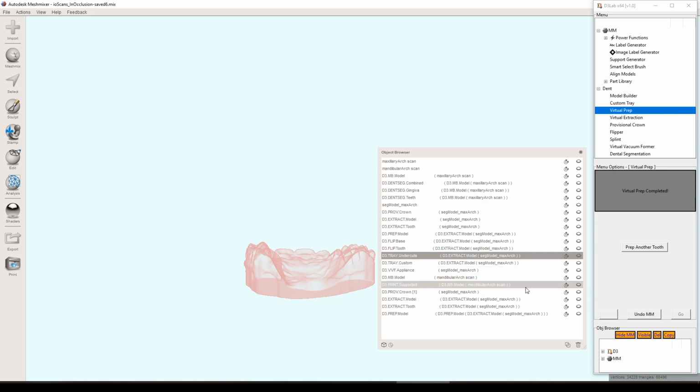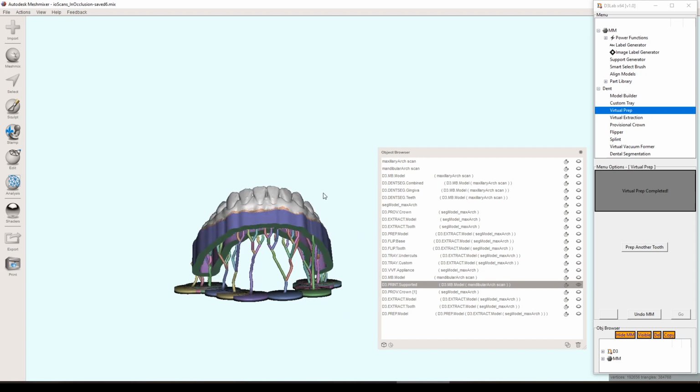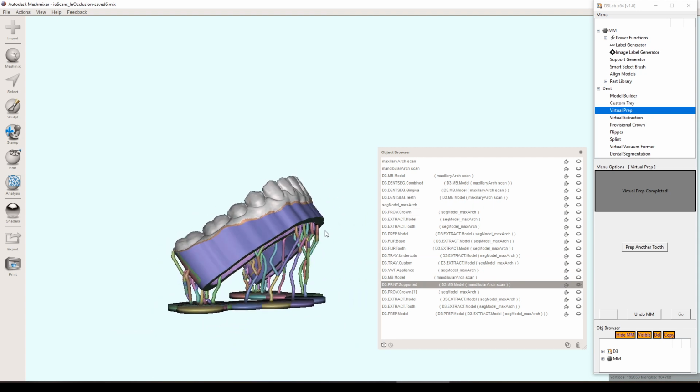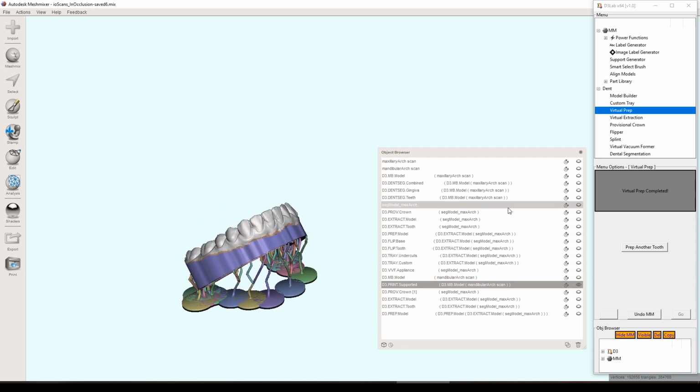Let's see, that's good. Oh, you can now, there's a support feature. So if you're going to be 3D printing your model, you can generate supports. I have it already dialed in for most resin settings. Actually, the vast majority of resin settings, this will be good. Might be too much in a lot of cases, but all the settings are there. You can change it to whatever you want, but at least it's there now, and it's preset for resin printers, and you barely have to tweak it if at all. So it's kind of nice if you just want to do that straight away. Although I think the vast majority of people are probably going to be doing that in their printing software, but still, it's here in case you need it.